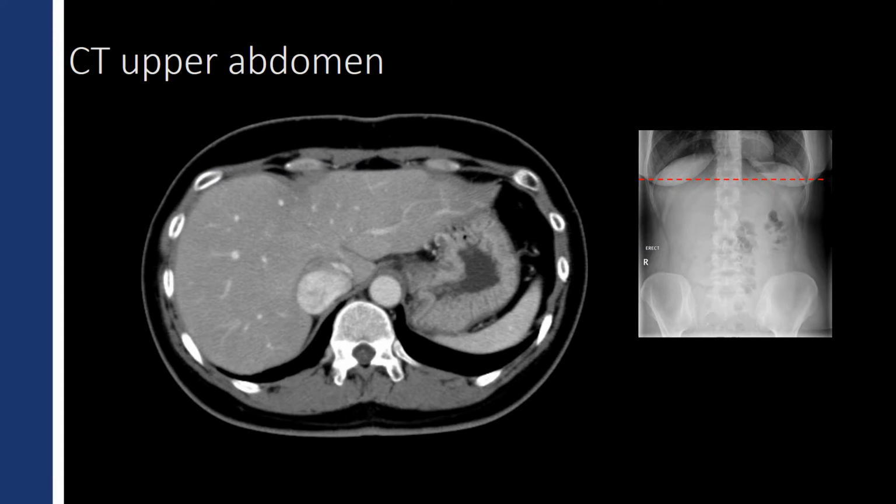So now we're just a little bit lower in the abdomen. We're still pretty high up, as you can see, first of all, by the index image, but also because posteriorly, we have the black lungs. Now, in the right upper quadrant and extending over onto the left side, once again, it's the liver. The liver pretty much dominates the upper abdomen.